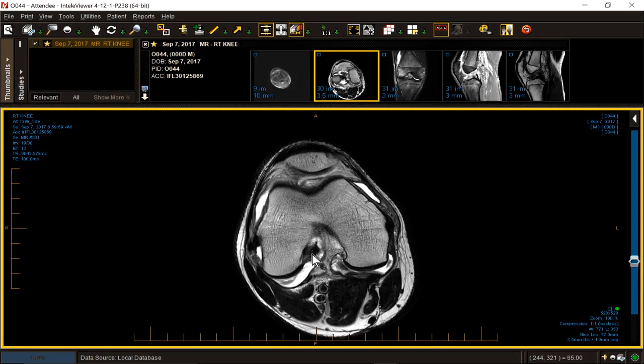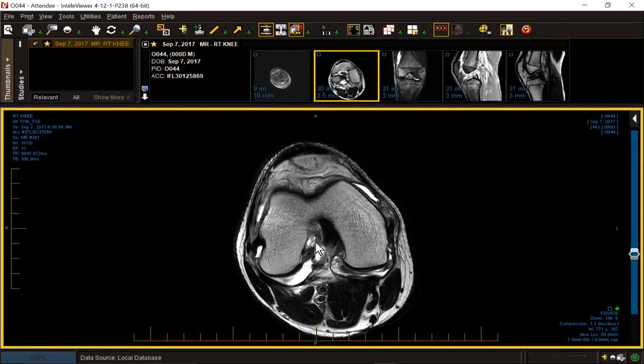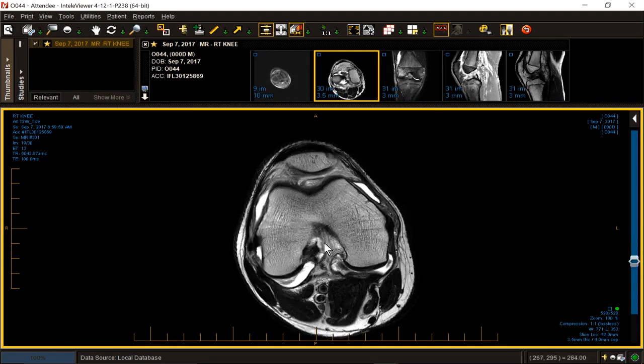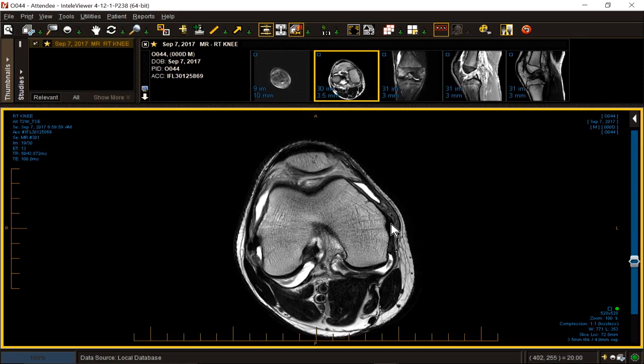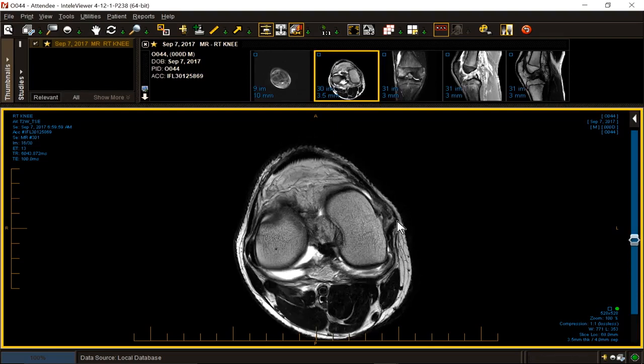Now, I like my femoral end of my ACL. I'm not too keen on the mid portion, though. It's getting kind of gray and fading away. I like my PCL. I like my middle layer of my tibial collateral, but I don't like my superficial layer so much. It's a little gray and a little fat.